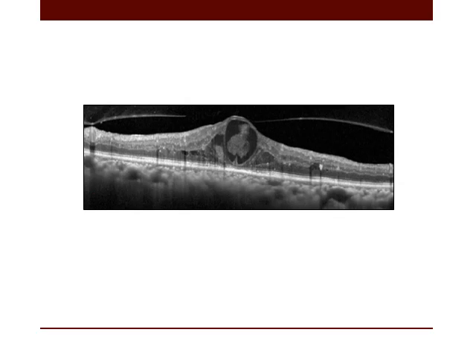It is very important also to obtain long line scans, not only in one direction but in all macular directions, because the central volumetric scan covers only a small area of the macula. It is important to see the macular periphery and all directions of the scan. If we take this patient, for example, the volumetric scan showed the presence of central cystic changes with hyperreflective contents and marked increase in the retinal thickness.